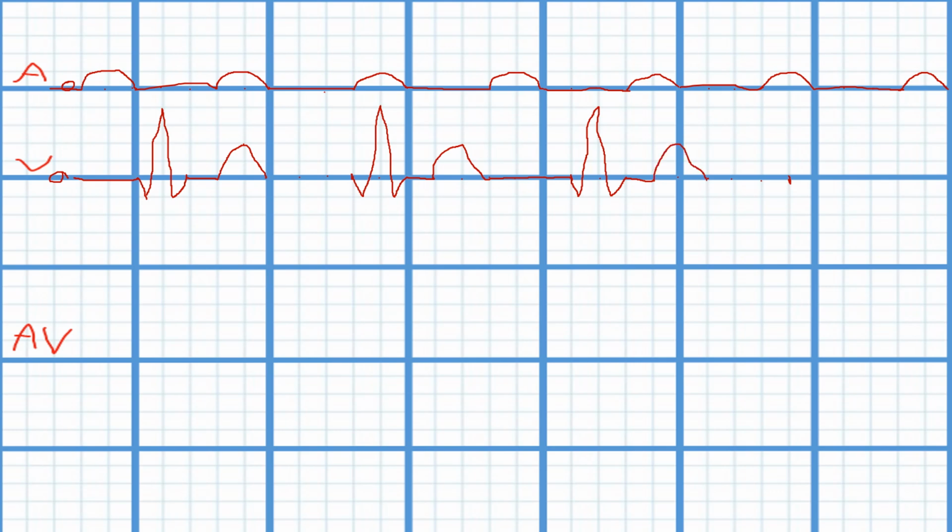All right, once again, we're at our baseline of 0, down to negative 0.1, up to positive 0.4, down to negative 0.1, up to 0, over, up to 0.2, down to 0, and we're going over here. And now we'll just connect the dots.